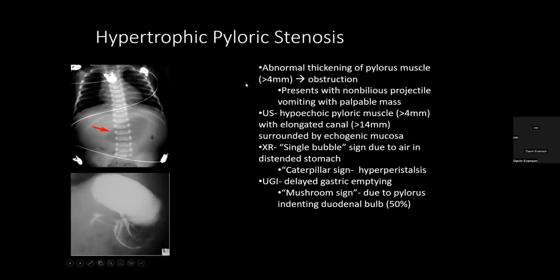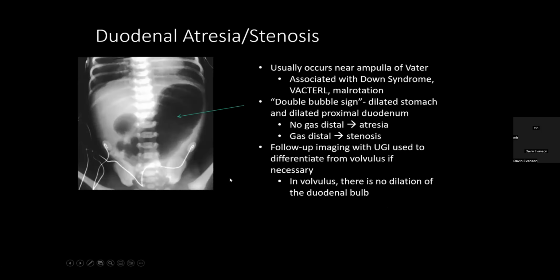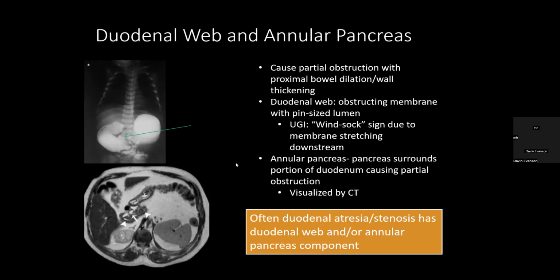Here, I talked about pyloric stenosis. In the old days, my dad was a resident using fluoroscopy, the string sign, marked narrowing, the tube is thickened. Now these days we'll use ultrasound. The double bubble for duodenal atresia. Again, looking for other syndromes. Talked about annular pancreas.